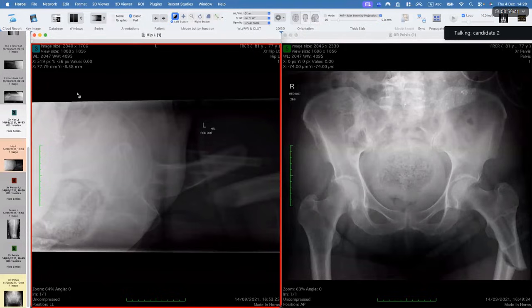Then the other thing is, in the proximal fracture fragment which is visualized on the lateral view of the radiograph, I can see some ill-defined lucency, but there is no underlying bone lesion. And I can see a few calcific foci in the left iliac fossa, sir. Ignore them, completely ignore them.